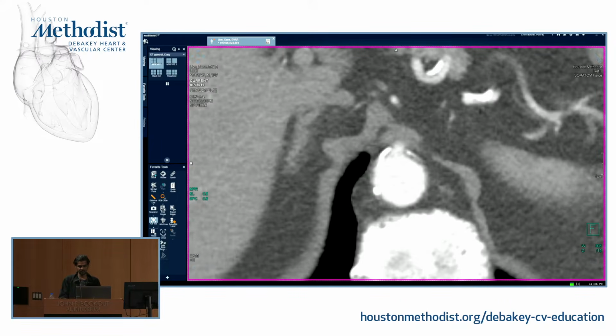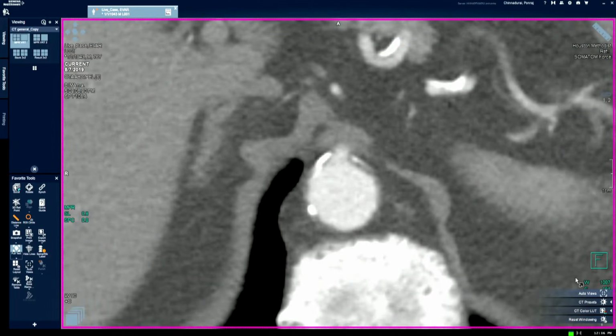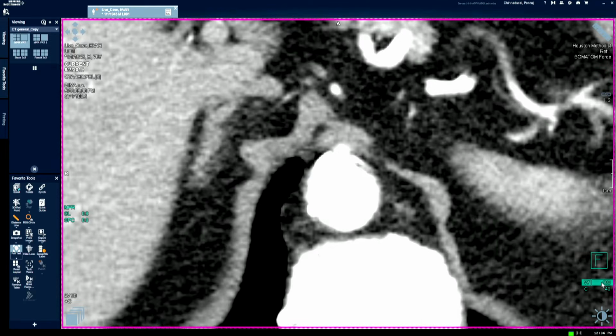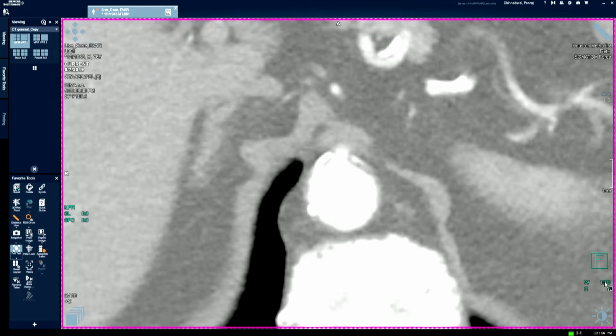Let's just focus on the window values here. This is your window width, and this is the center. I don't know if you can read it on the bottom right. Maybe I can make it bigger. Let's say I leave the center of the window value as 0, like we talked about, and in the width, I make it 1,000. The center is the same as window level, right? Yes.